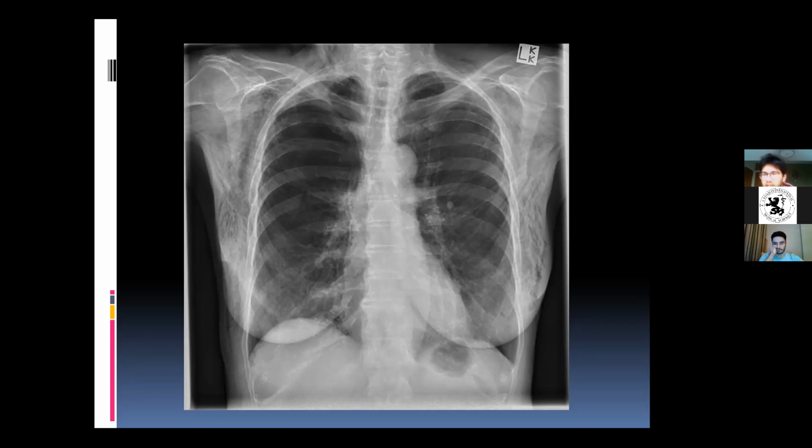This sign is called the ginkgo leaf sign. God knows who named it like that, but that is the sign. You can see that very clearly towards the edges of the right pleura. Usually we expect the subcutaneous emphysema to be absorbed by the body, and it should generally go away by itself. There are cases where it doesn't, and in those cases surgical intervention might be necessary. But again, the risk is that you might be exposing them to even more air entering.